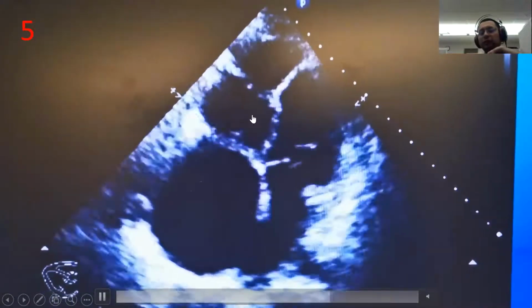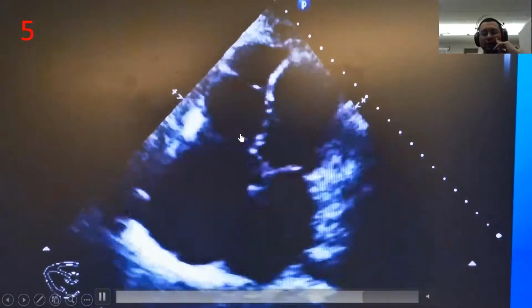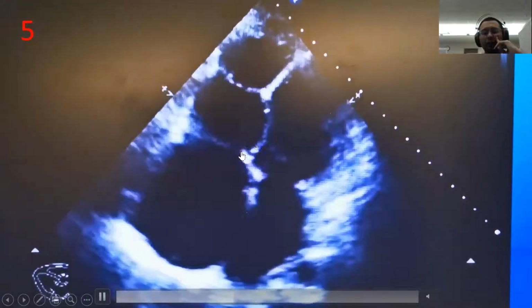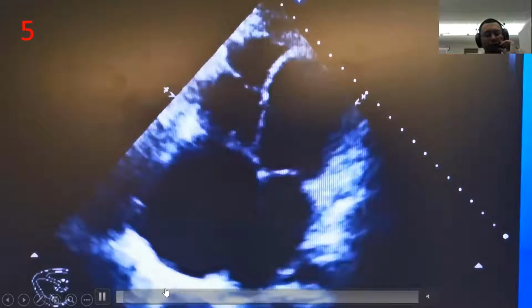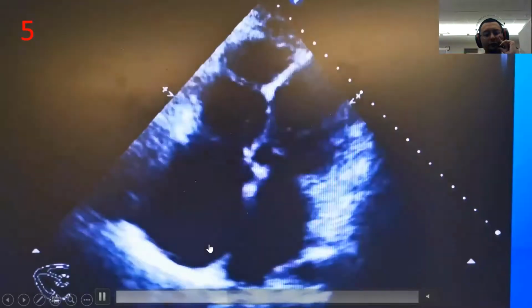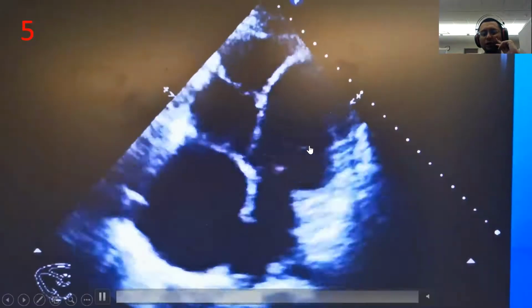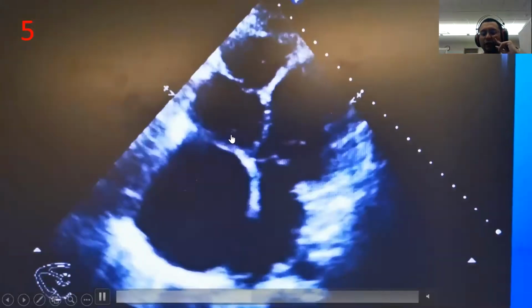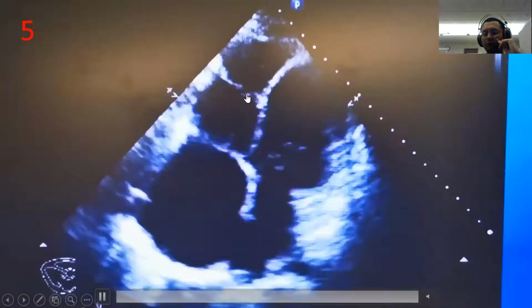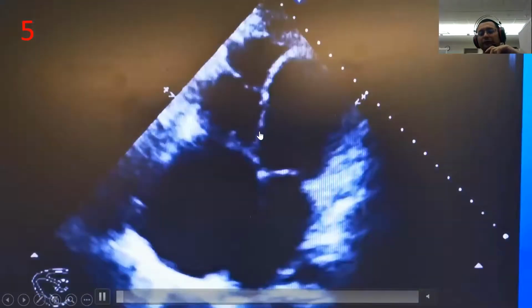So whenever we want to identify the right ventricle, that is one. What other things about the right ventricle? What about the leaflet? What is unique about the chordae of the tricuspid valve, Sarah? It is attached directly to the valve. All chordae attached to the valve. So the attachment of the chordae, you are correct. Chordae normally attach to the papillary muscle, right? But there's something special about the tricuspid valve. The chordae attach directly to the septum. Okay, some of the chordae attach directly to the septum.